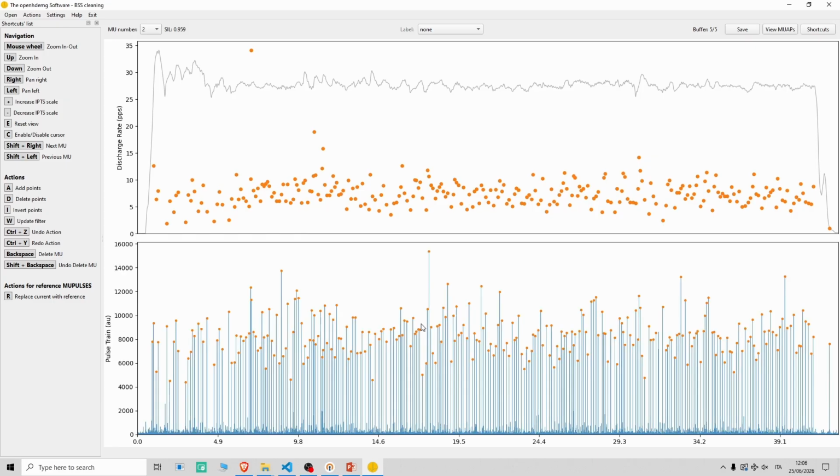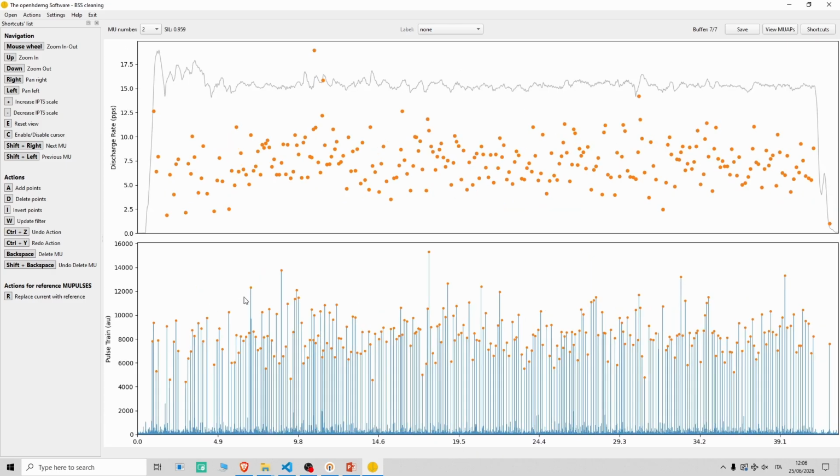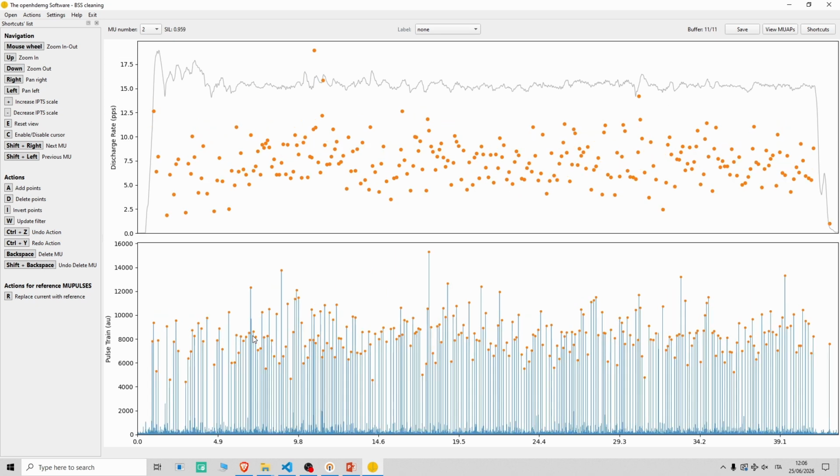And you see that as soon as you start manually editing your file, the discharge pattern of the motor unit will become more and more consistent. And when we do coherence analysis, we want the most consistent possible pattern. We want to have the best firing motor unit. Ideally, something like this, which has a bit of physiological variability, but it doesn't have holes, it doesn't have discontinuities, and so on. So, for example, we may want to add a firing and update the filter and so on.